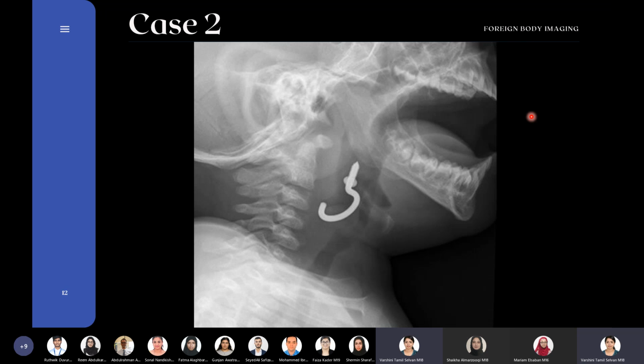Let's go by how we normally look at the radiological scan. So is it an X-ray or an MRI? Is it a soft tissue radiograph or a skeleton radiograph? What is it? What do you guys think? This is an X-ray. Yes? Go ahead, answer. Okay, this is an X-ray. And what is abnormal here? What do you guys see that's not normally there?